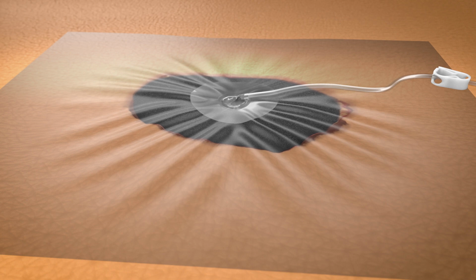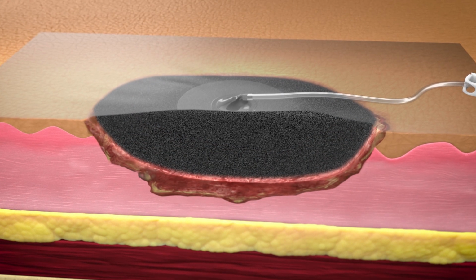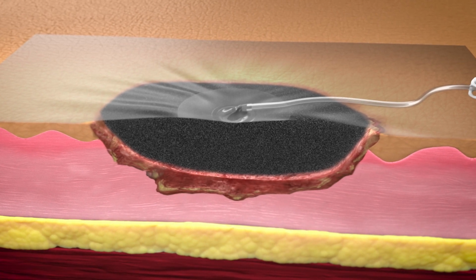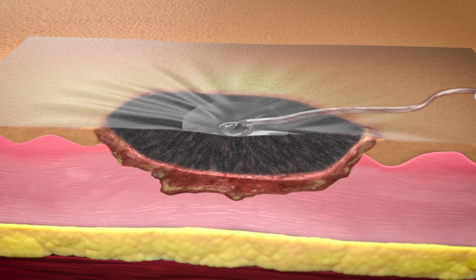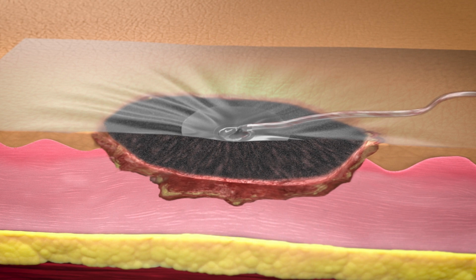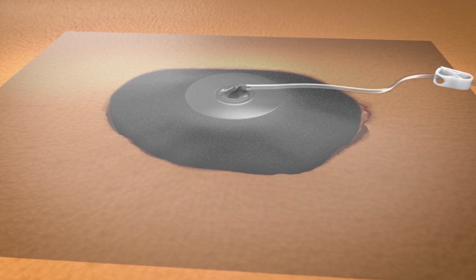It also provides alarms when there are conditions that would impact negative pressure wound therapy. The application of uniform negative pressure when delivered by 3M VAC Therapy applies mechanical forces, macrostrain and microstrain, that together remove exudate and infectious material, reduce edema, and promote perfusion, creating an environment conducive to the formation of granulation tissue.